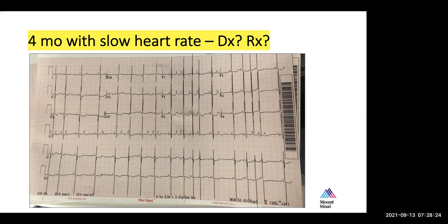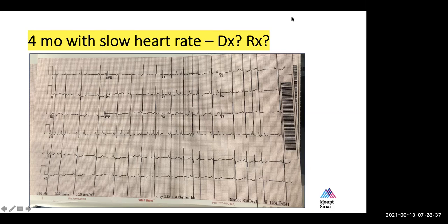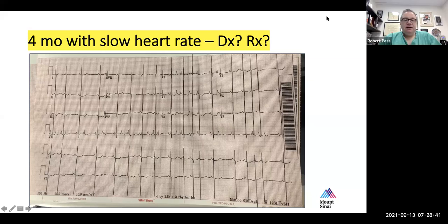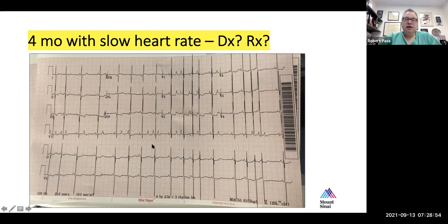And there is definitely some AV conduction. The heart rate seems irregular with that. Does this patient have AV conduction disease? I agree with everything you said, by the way. This is a patient who probably has EAT. But I also agree that this P wave, for example, is not conducted, right? Nor is this one. Is that a sign of the patient having AV nodal disease?